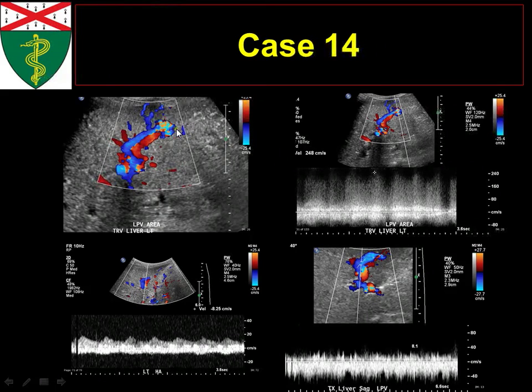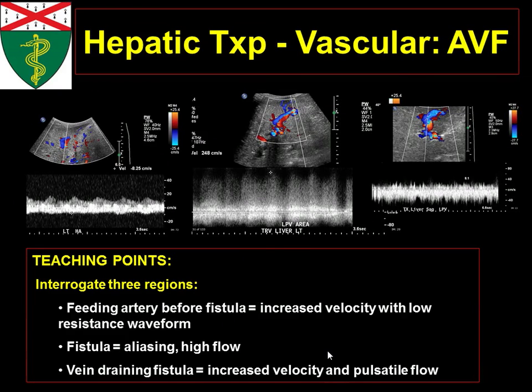And now this portal vein, which generally is not used to getting any direct arterial flow, is getting so much arterial flow that it demonstrates all these sharp peaks, which are all telling us that there's pulsatility here. So it's feeling the pulsatility of that hepatic artery. If you can put that together, that implies it's a hepatic arterial venous fistula essentially. That's exactly what this says over here.